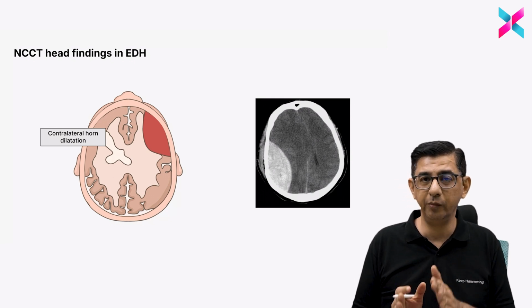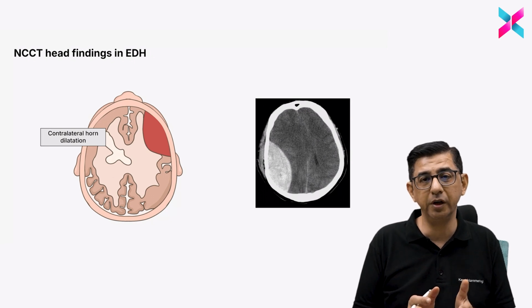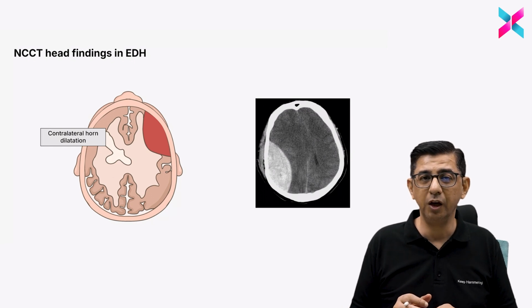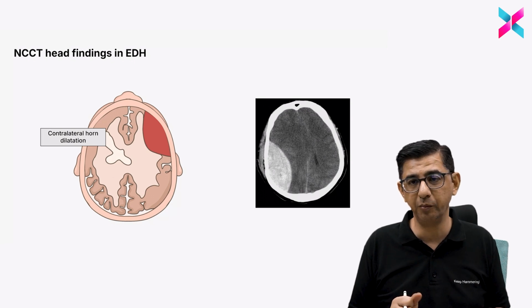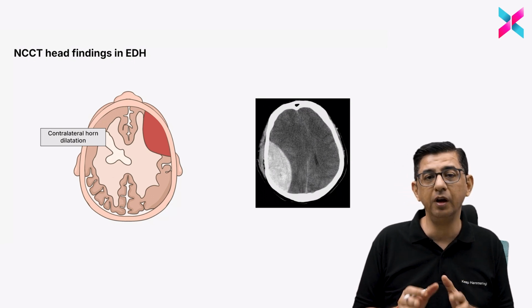So I've tried to highlight midline shift. What I've tried to highlight is subfalcine herniation, that is a horizontal displacement. And then I've also shown a CT scan in which there is a biconvex hyperdensity. Even a little lateral to that, what you can check out is a subperiosteal bleed, because he fell down. So there is some evidence of subperiosteal bleed, but that biconvex hyperdensity is very hard to miss.